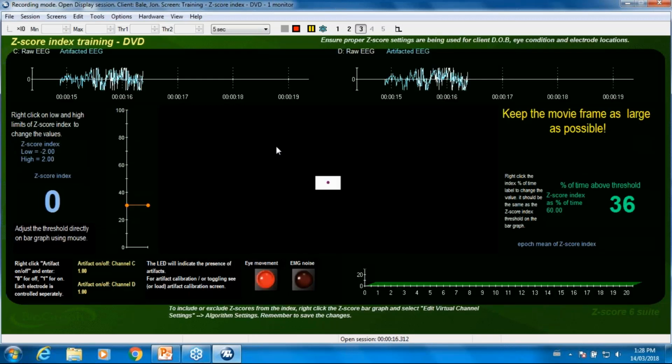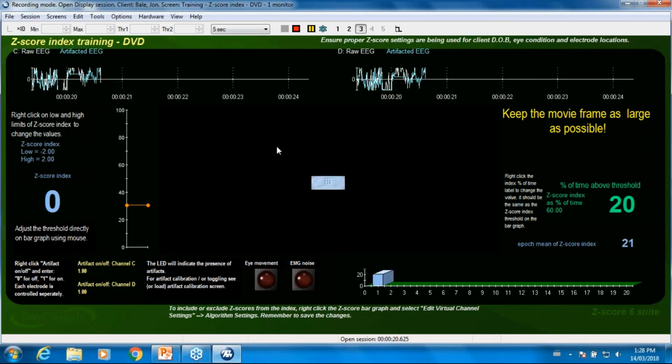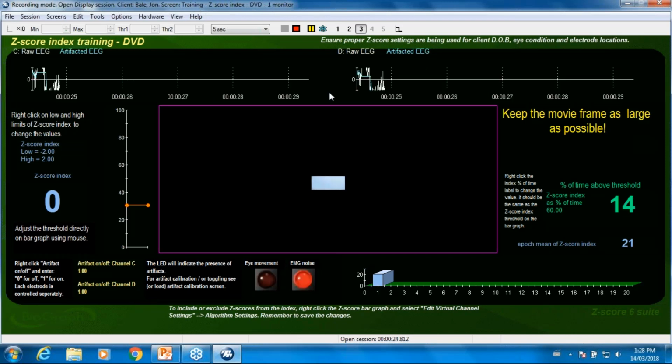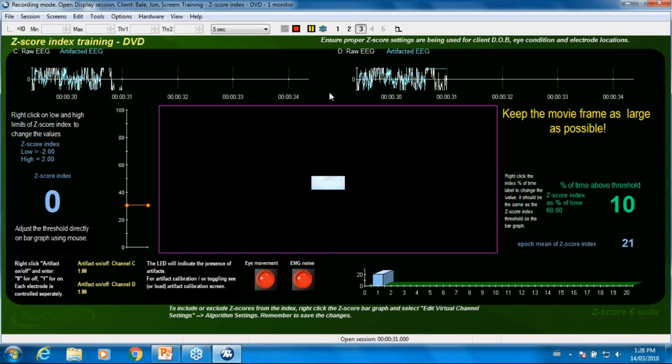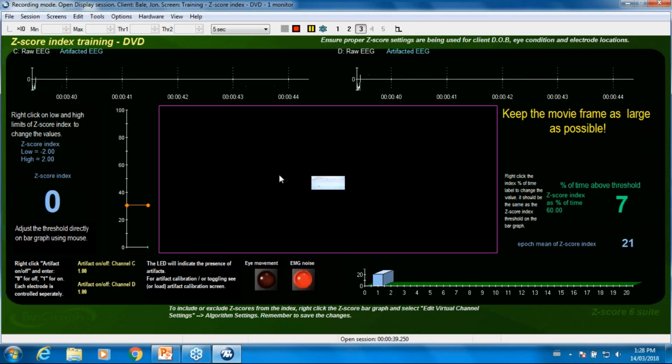Now within the software, we also have training if you're using online videos from the internet or DVDs and stuff like that. This is a particular YouTube video I'm using for feedback. This is something I've discussed in other videos, but yes, we now have feedback from YouTube. If you're not using it, I suggest you should use it because it's pretty darn cool and clients react very, very positively to it. If I were to stop talking and my stats would rise above this threshold, this YouTube video picture would enlarge.